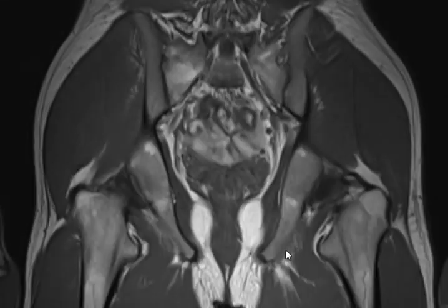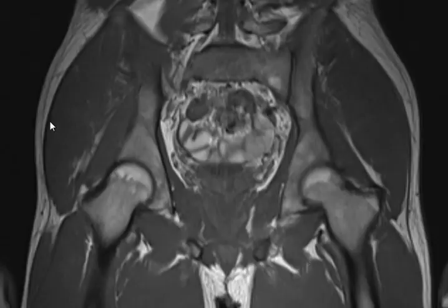There's contrast. Yes, contrast. Go down, down, down, down. Yes, and these are the contrast images. This one? No, no, the last one. The one before the last.